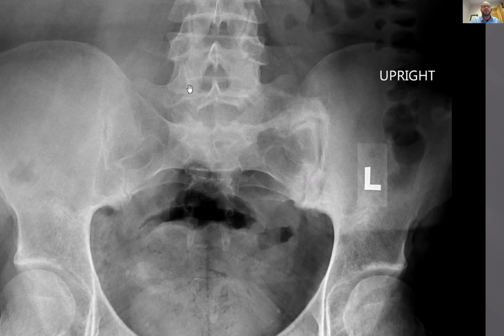And also, there's an increased incidence of disc herniation at the level above. So I think both things are happening in this patient. Instead of giving this person a seronegative spondyloarthropathy, we've got to think of the biomechanical changes that go with these really cool transitional segments.